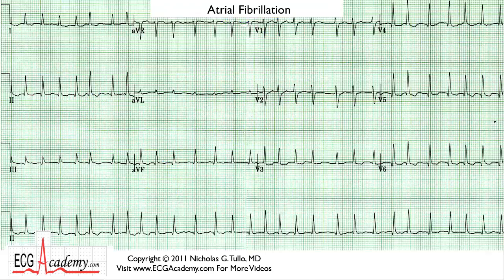This is the kind of cardiogram you'll see frequently in an emergency room, and when you first see it, it's very impressive, and the patients are usually rather uncomfortable. Glancing at the rhythm strip, you can see it's really quite rapid. The average heart rate here is over 150 beats per minute. It has to be in the range of 165 to 170. It's irregular. There doesn't seem to be any pattern.